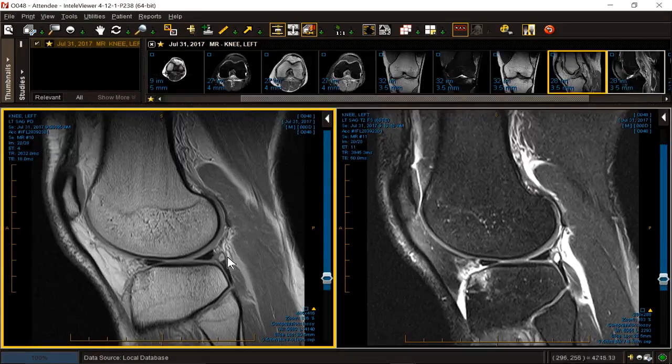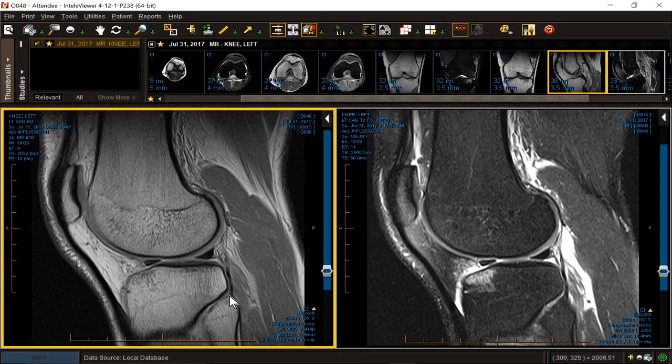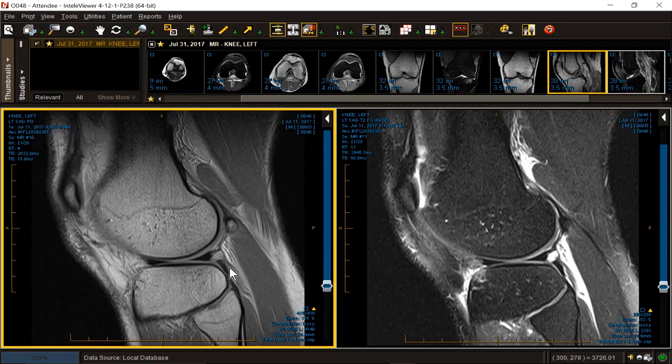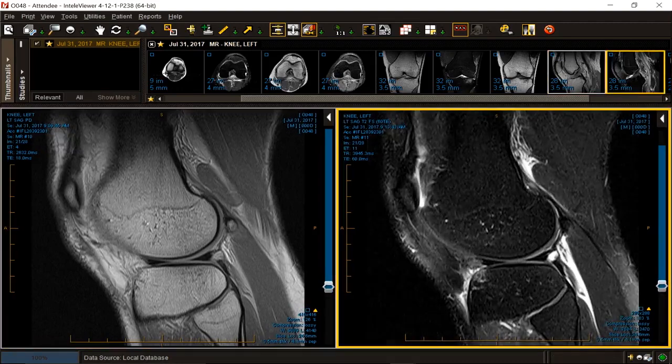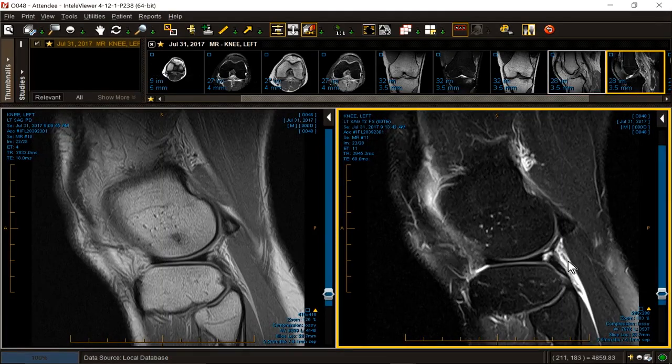Let's go over to the lateral side. This time we do not have a mermaid sign. We have a beautiful popliteofibular ligament. We have a beautiful view of our meniscopopliteal upper fascicle. Our lower fascicle is intact. It's a little bit swollen. And we have torn the arcuate. There's the arcuate right there. We have a free arthrogram of the arcuate produced by blood. There's the arcuate, one limb of it. It's kind of shredded looking.